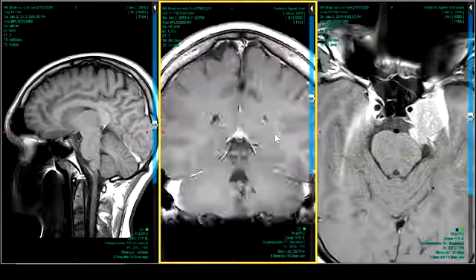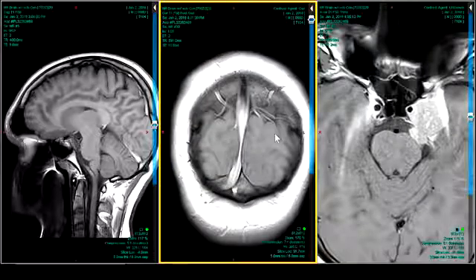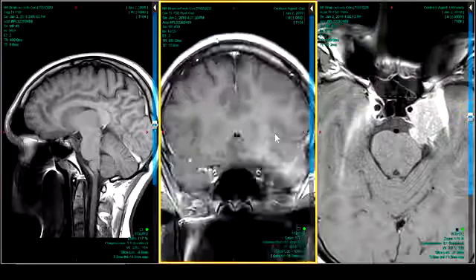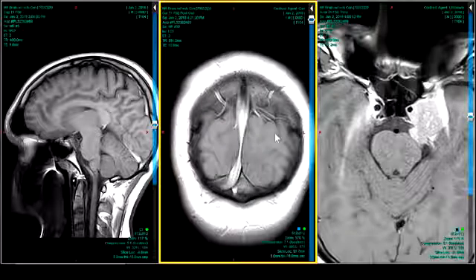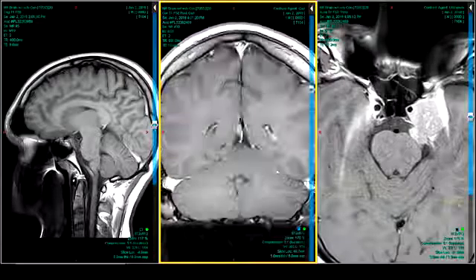I certainly would go through the entire image, cranial nerve by cranial nerve. It wouldn't take me an hour to do that. I'd do it pretty quickly, but I'd examine every single cranial nerve looking for schwannomas. I'd check the rest of the brain for meningiomas. I would not necessarily do a spine survey to look for NF2. If this is a solitary lesion, I'm done.